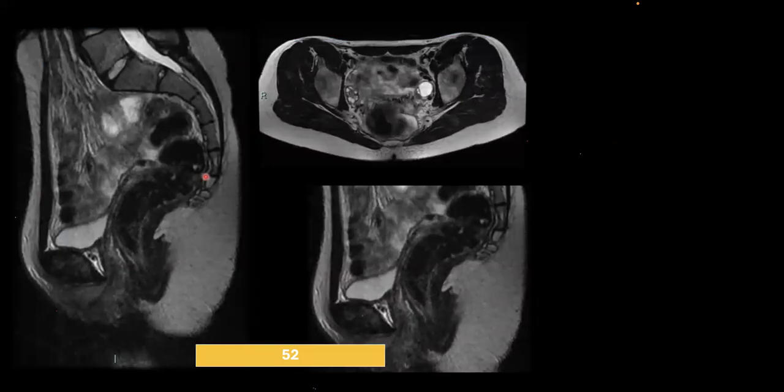Can you see the uterus? Very good, iPad. Yes, very good, all of you. So not always do the images have to be very apt. Sometimes you have to look through, because I think these images are not that good. But still, if you can pick up the ovaries and absence of uterus, you come up with a diagnosis.